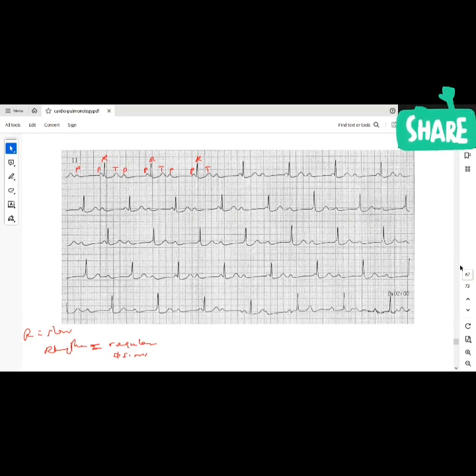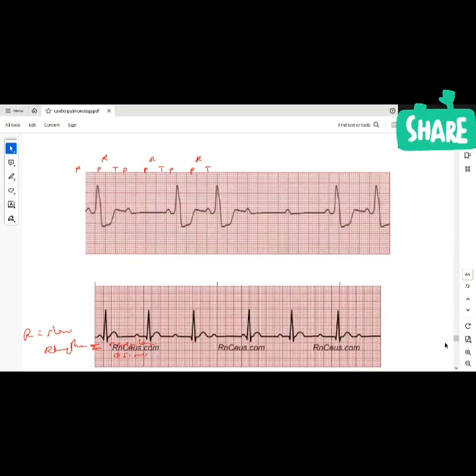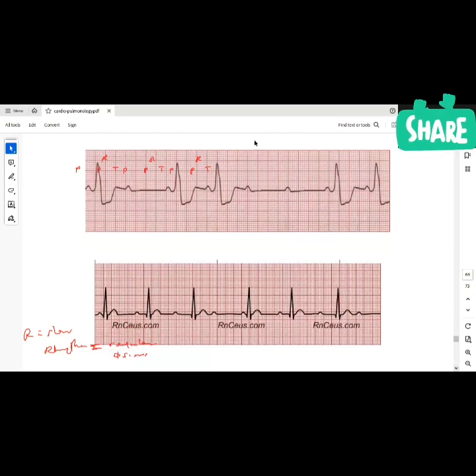You're going to know by looking at the rate. Let's check the P wave. What's the rate of the P wave in this person? For the second degree blocks, the rate is 1, 2, 3, 4. The rate for the P waves is basically the same, and they're also regular, and we have dropped beats.